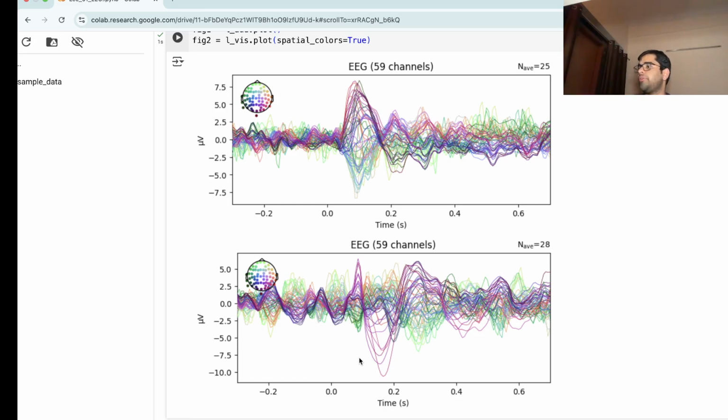That is why you call it P2N, or if it first goes negative and then positive, it is called N2P. So N occurs at 200, then P occurs. N to P and P to N are usually the visual evoked potentials. Whenever a stimulus comes up on a screen, you see a nice P to N or N to P, depending on which side the stimulus is, or if it is central, you see most of the electrodes showing the N to P signal. Okay.